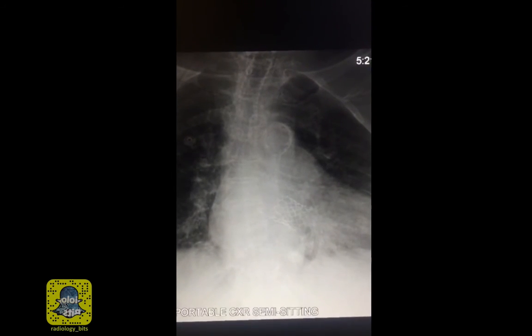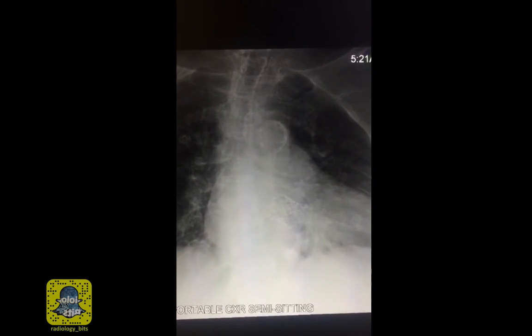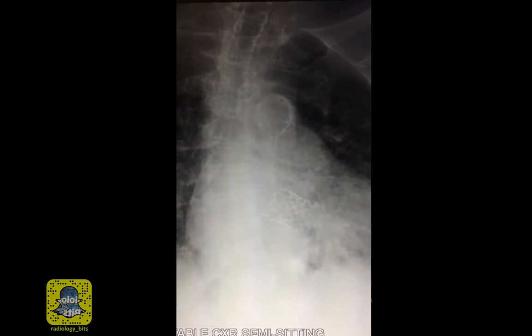There are different approaches to inserting this by a catheter. The most likely would be a femoral approach. We have two types of stents that could be placed currently, balloon expandable and self-expandable stents. And finally, we learned how a post-TAVI chest x-ray may look like.